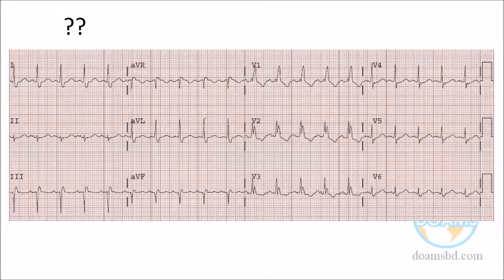Yes, Ankit also can talk now. So this is a fractionation. Sir, right bundle branch block. You are giving the answer. Just be with me. Is it an M pattern or W pattern? Sir, M pattern. Is it RSR or RR? Sir, RSR. Where is the S? Anyone? Is there any S here? Who can say?